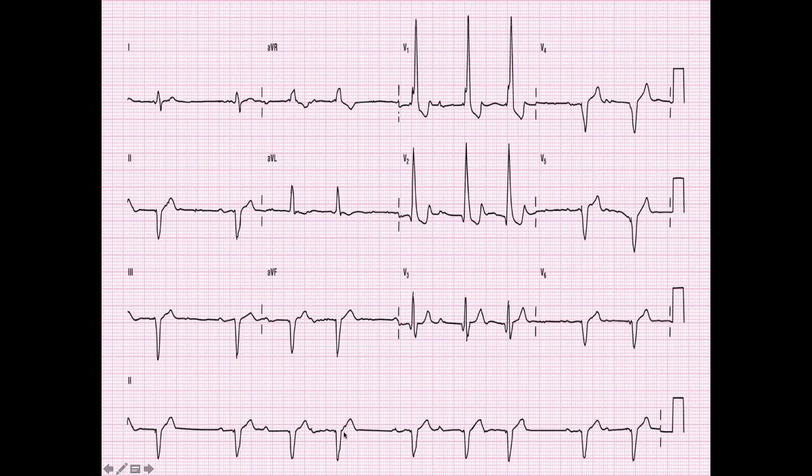So your P wave buried in this T wave, but with this P wave, there's no QRS complex associated with it. It's a skipped beat, and we start all over again. Lengthened PR interval, and then lengthens a little bit more, buried in here, totally buried in here, and we skip a beat again, right? So here we have a second degree type 1 AV block.